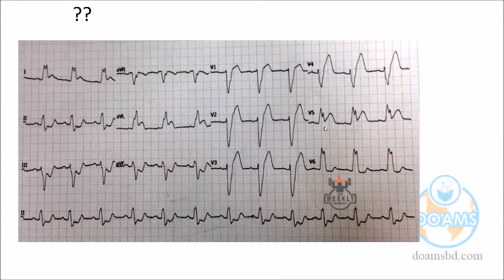That means it is in the left-sided leads. Yes, left bundle branch block. I think everybody will agree. If you don't agree, raise your hand. If you want to say something, you can say. Otherwise, lower your hand.